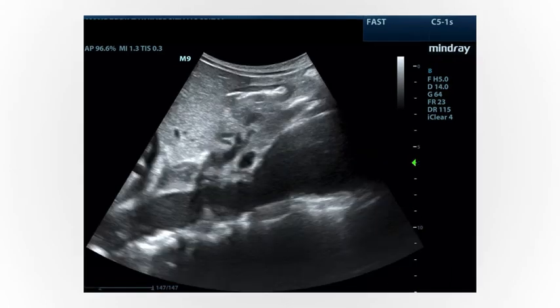What do you think? Well, I hope this is a pretty obvious distal aneurysm. Remember that the aorta normally tapers distally and that most aneurysms are infrarenal, so the longitudinal view may help.